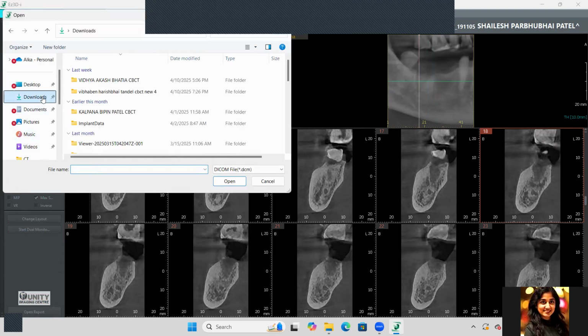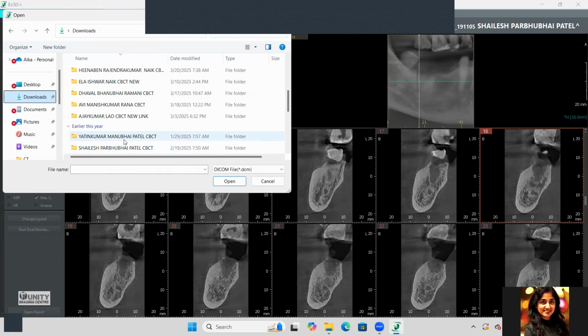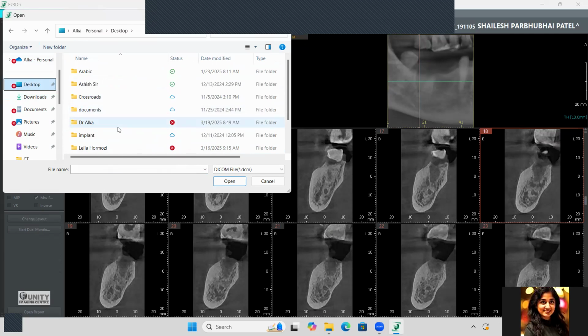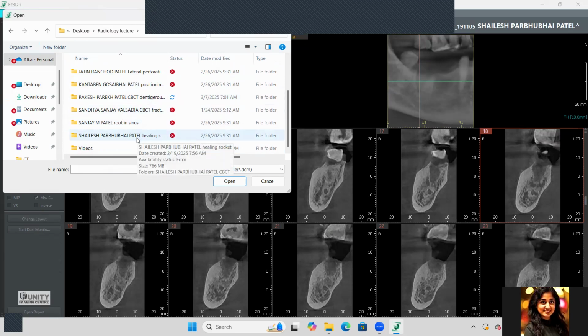I was trying to find anything related to endodontics, but I'm not able to. Usually minor cracks in RCT treated teeth with crown, unseparated cracks, are not visible in CBCT because of the crown artifacts.